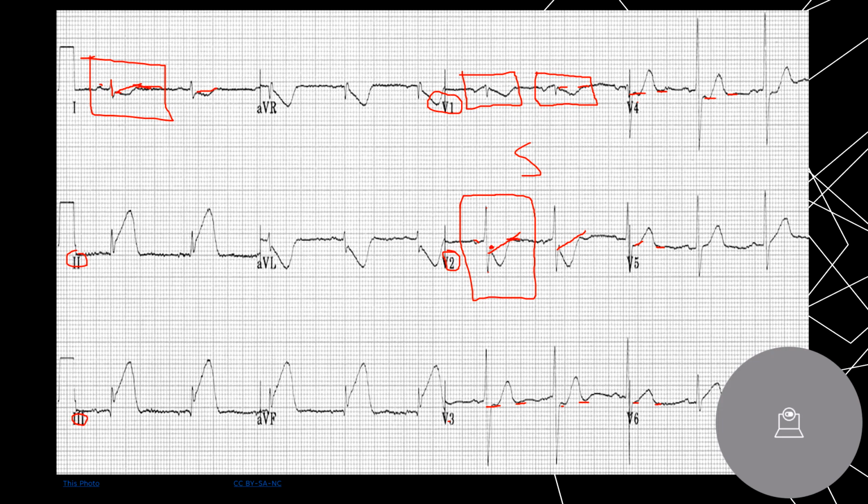Inferior wall, right? This is what sticks out. Okay, this is one whole complex. This is your QRS right here. Okay, so this is T wave, and this is T wave. But you see how very pointy they are? This is actually hyperacute T waves. But 2 actually doesn't have a ton of elevation, it only has a millimeter, it just looks huge. But then you go into lead 3, this is termination right here. And boom, this is baseline. So significant elevation here, significant elevation, right?